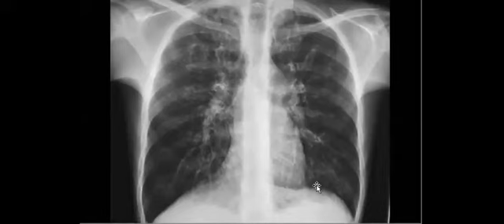If you want to add to this image a tube or line, what will you add? Portacath. So when you find a portacath in a young patient and you find something in the lung, equal in the exam to cystic fibrosis.